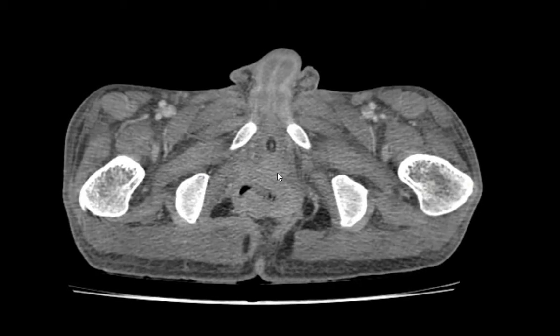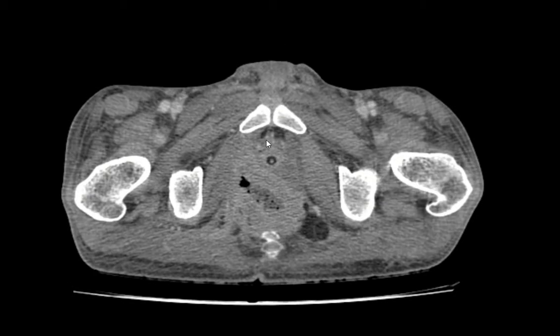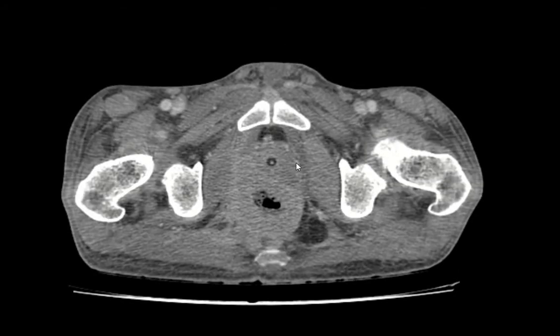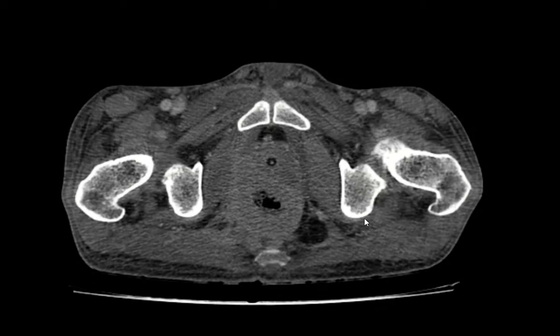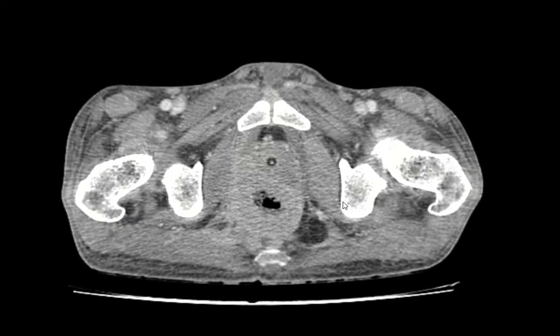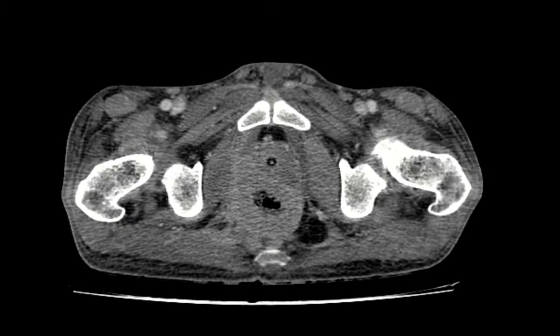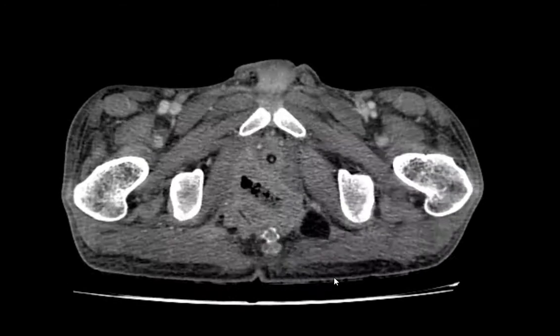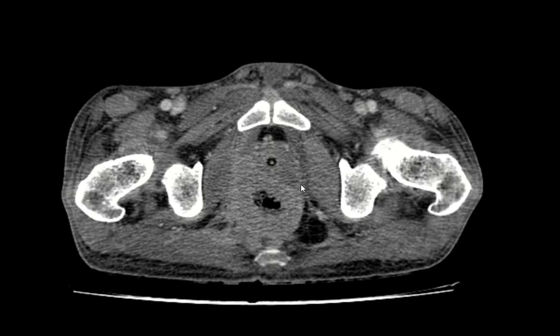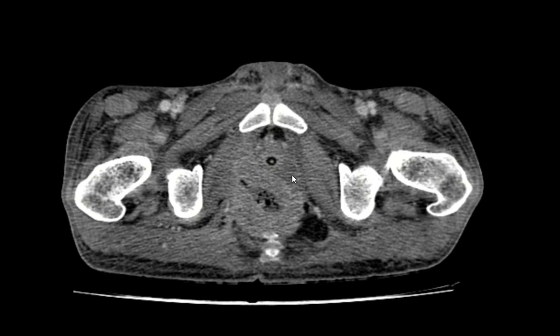And when you go upwards, it is also involving the prostate, which is appearing more hypodense there. I'm sorry, hypointense is what you mention when you are reporting MR. Okay, let me just continue on. I was just playing with the contrast to make sure that there is indeed a difference.